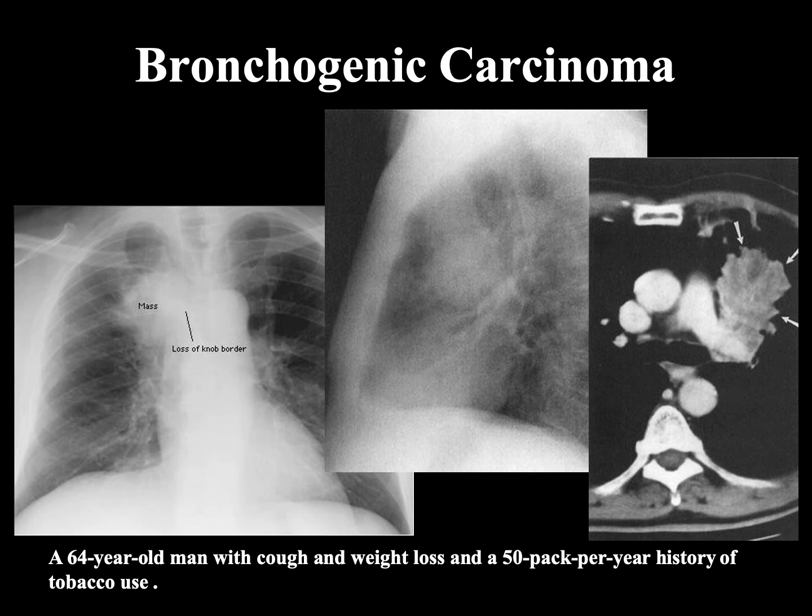And then you see the carcinomas here. You see a big mass right here, pretty solid looking, almost golf ball looking mass sitting in the lungs. So this would be a lung mass. Here you see the CT scan. You see this differentiation. You don't see these nice round borders. This has got a lot of projections off of it. So this is more of a carcinoma. So not a good history here for this patient.